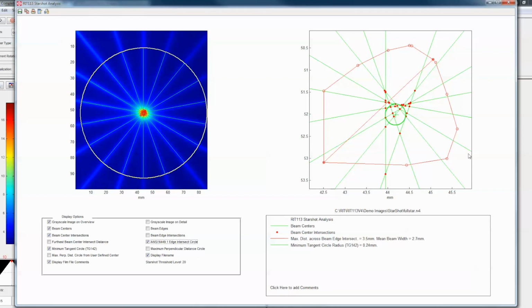And so this is what it would take here in order to do this, and you could see this is the defining radius here for that. It's not used very much anymore, but we did want to include it because several of our customers still rely on that method. And so it's easier just to uncheck this if you don't want it anymore.